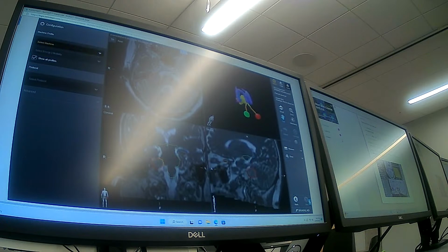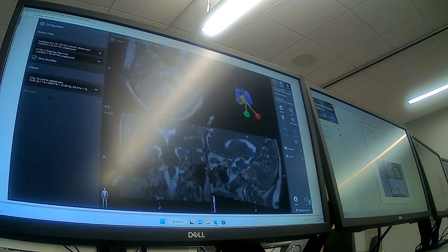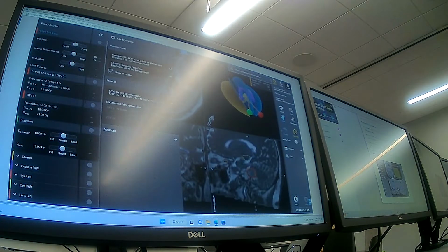The priority means how important it is. 100 means super duper important, 50 is okay, 0 is not important. You got to try that. And the 50 is average, think about it. So the optimization says, okay, there's something there, think about it. 100, try to do it.